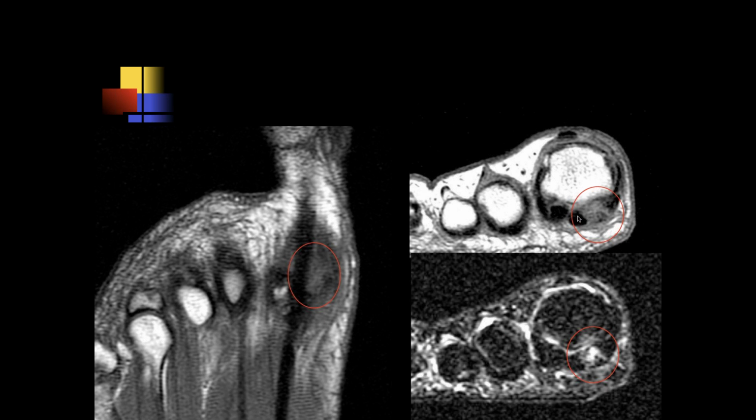I'd like to look at the other images. Yeah, right there. That's where it belongs, next to that little thing there. So in this area, I'd want to look at all the other images.